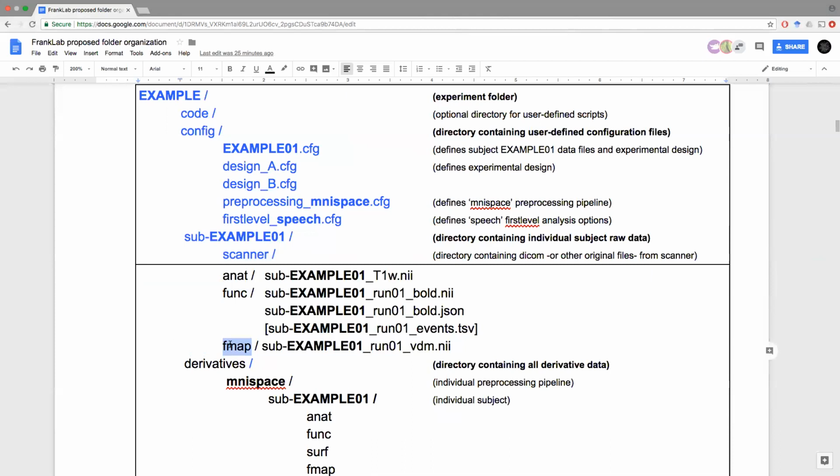Okay. So let's say you were to run some analysis and then you're like, oh, wait a minute, something got goofed up with the FreeSurfer processing, or we went in and noticed that there was something we could correct, and then we regenerated some of this stuff. Right. You need to re-import. When we do import, will it update those files? Yeah, import will overwrite basically all of that information with information that you are importing from. That's the one tricky thing with having a copy, just making sure that copy is reflecting whatever file you want to look at. Right. Exactly.